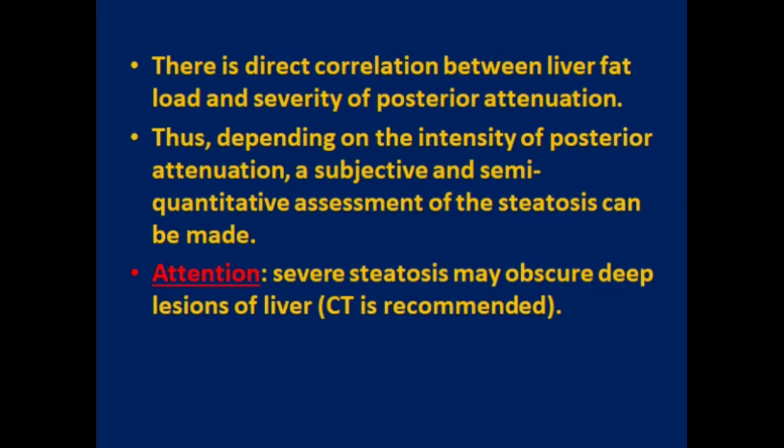There is a direct correlation between the liver fat load and the severity of the posterior attenuation. Therefore, depending on the intensity of posterior attenuation, a subjective and semi-quantitative assessment of the steatosis can be made.